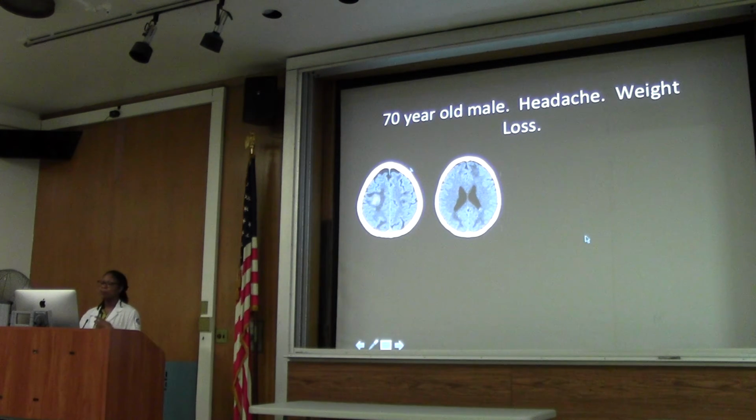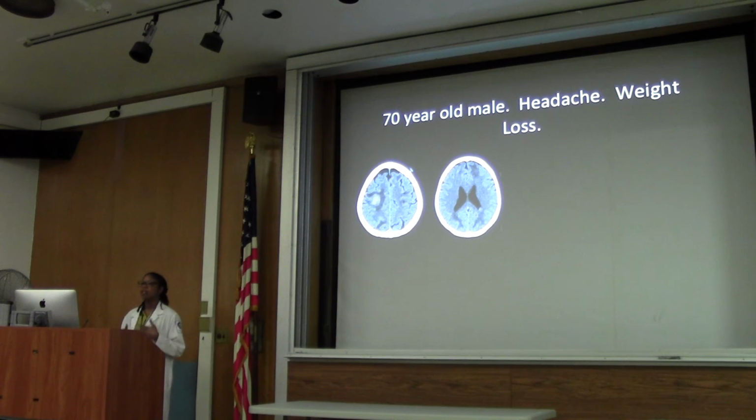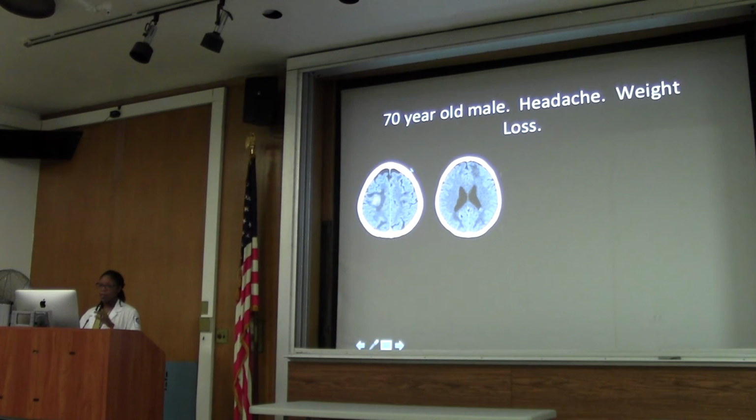And I'll just say there's a difference between vasogenic edema and cytotoxic edema. Cytotoxic edema is associated with strokes. Vasogenic edema tends to be associated with masses and infections. How you tell the difference is that vasogenic edema is in the white matter and has a finger-like appearance, like fronds. You can see here, it looks finger-like. That's because it's confined to the white matter. Cytotoxic edema results in blurring of the white matter and the gray matter equally, okay? So that is how you tell the difference.